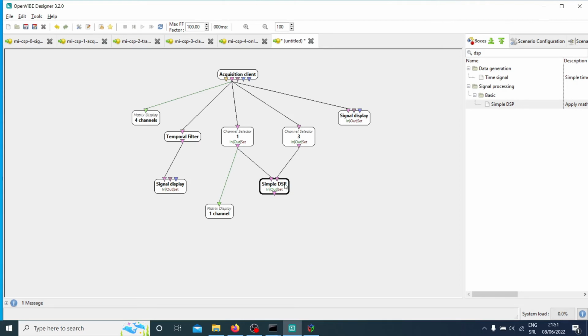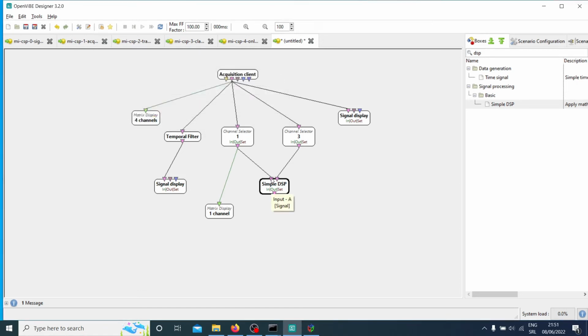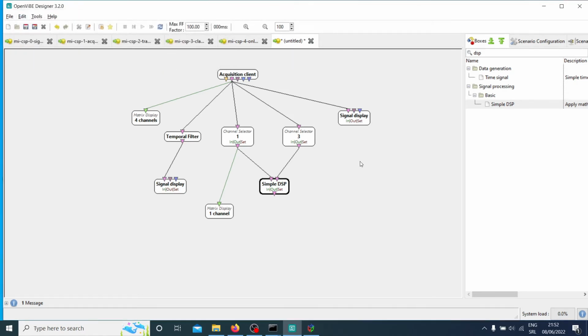Okay, that's cool. And so here I want to do, for example, just in case I'm not sure if XY works, what is the real nomenclature, the naming, but you have input A, input B, and let's just call it A plus B, or A times B. You can do whatever you want; I'm just giving you some ideas. Then you can display that again, see the matrix. Oh, wow, that's cool how it looks. My signals are being summed or subtracted or whatever.